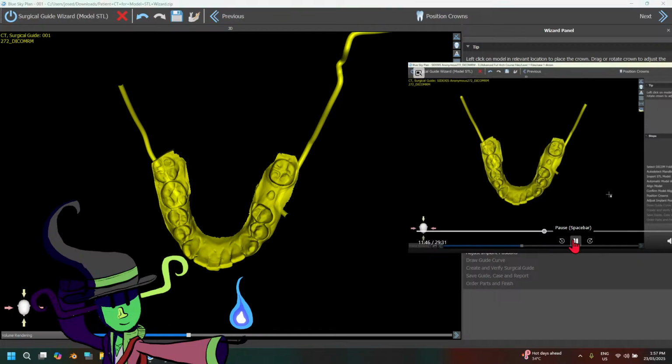And you'll see when I get back to this 3D window, I've got a tooth beside the crosshair. That's indicating that wherever I click next, it's going to design this wax up. Alright, so I'm going to click right in the middle of the edentulous side. It does matter where you click. Don't go over here and click on the opposite side, or it's going to try to build a tooth over here. Okay. Click in the middle of your edentulous side. So a single left click. Alright, single left click. Boop. Alright, let's go generate some teeth.